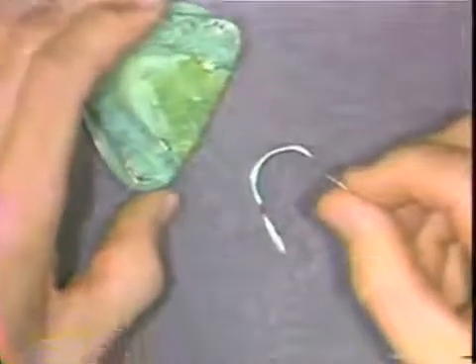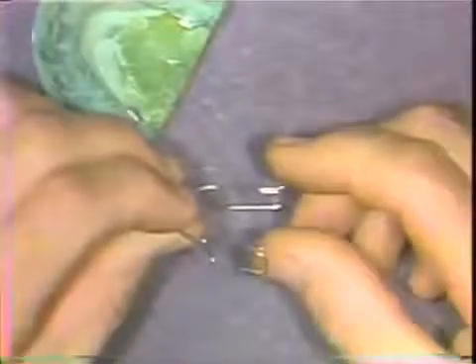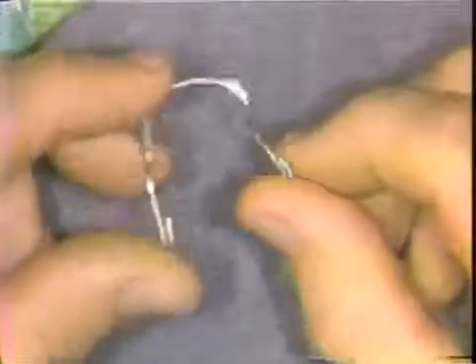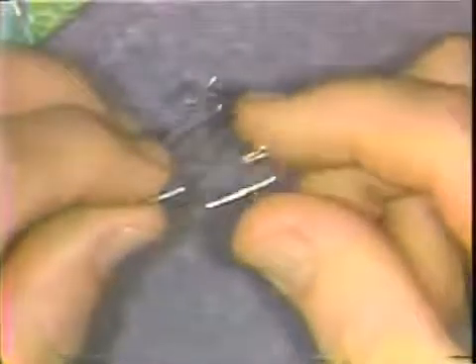The lingual arch has many, many purposes in conjunction with conventional orthodontic appliances. Its purposes can be divided into a passive and an active component.